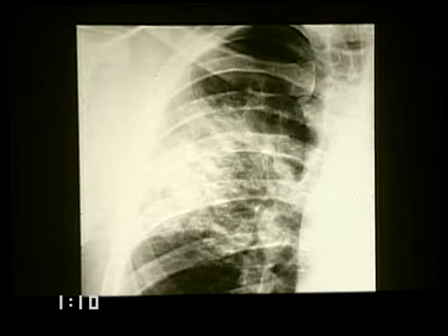This is consolidation in the sense that when the clinician goes through the classic maneuvers of listening and percussing and doing all of these other ritualistic things that they pretend to do before they get the chest X-ray, they will find on this that there will be dullness on percussion, and because we have this consolidation with patent bronchi, they will also hear tubular breathing and all of these other things that please them.